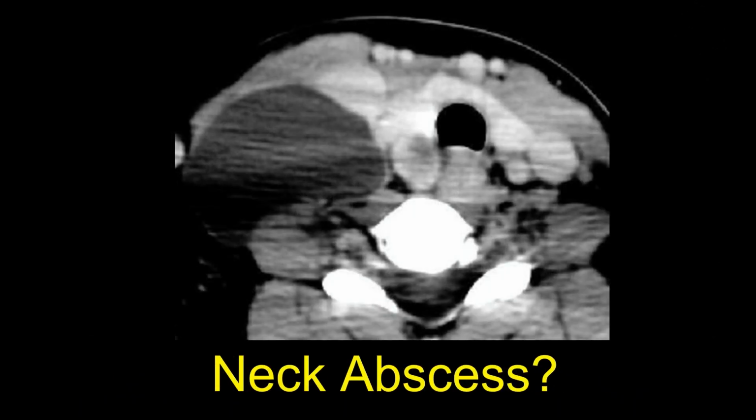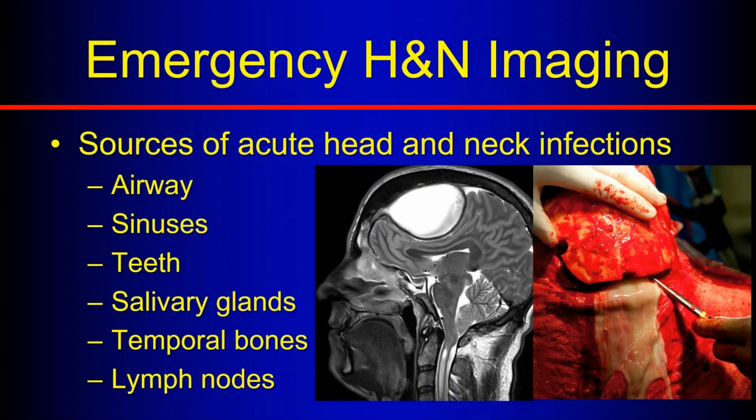And anytime we see weird cystic masses, especially in a young woman, we think about differentiated thyroid carcinoma. So in a young woman, if we see a big, strange-looking cystic or necrotic-looking mass that looks like it's fluid density on CT, we look very closely at the thyroid, and here's a thyroid primary tumor in this patient who turned out had differentiated thyroid carcinoma. So that's kind of a review of some infectious and inflammatory changes and what we might see on emergency studies in the head and neck imaging world.